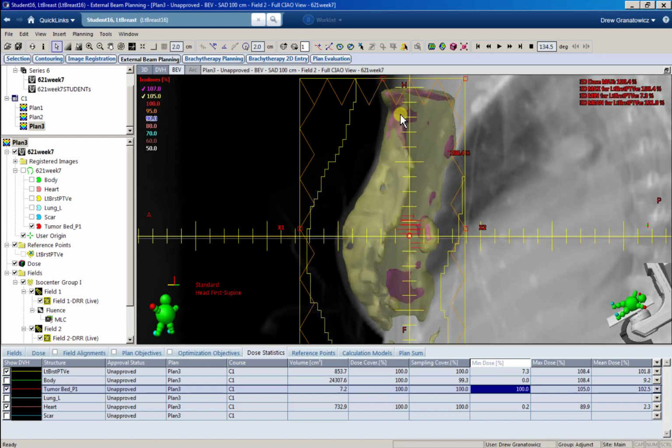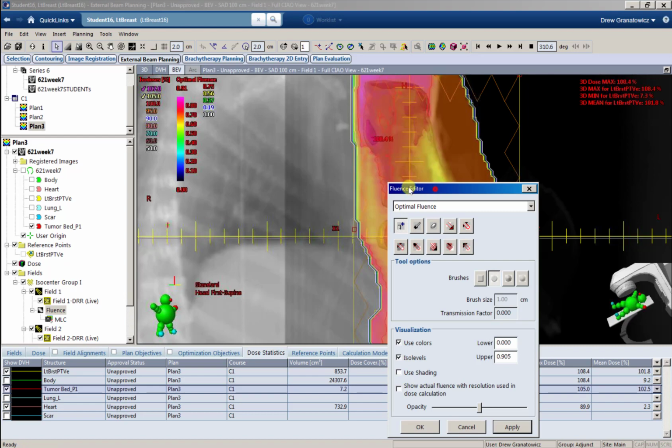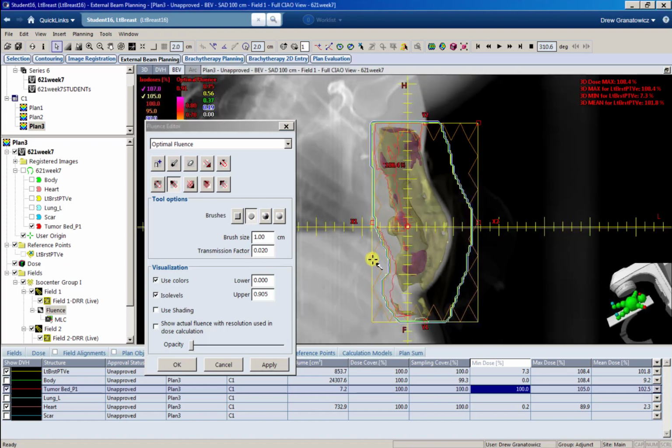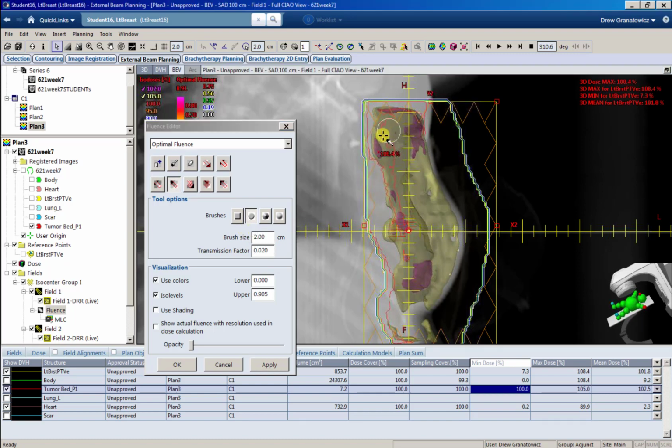Okay, so now we can try to paint out all this, but we're not going to come anywhere near that GTV. So we'll decrease by our 0.02 like we were in the beginning. A lot of 105, so I'm going to use a big brush. Paint all this out.